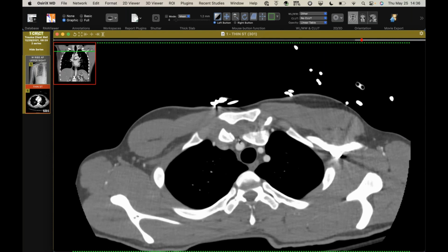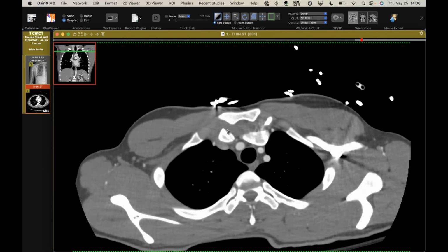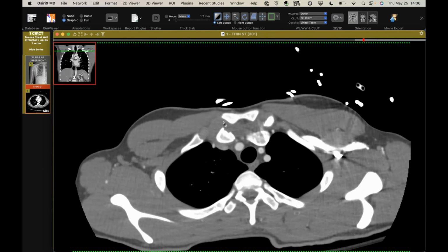This is not that common of an injury, and it's usually associated with high energy trauma because it requires a direct blow that disrupts this capsule. Sometimes you'll see it with a distraction injury, but it's usually associated with severe injury to the arteries, the vasculature, and the brachial plexus. There's often a lot of fractures here too, the thoracoscapular dissociation. But in this case, it was a direct blow, and because he's young, his bones are pretty tough. Probably the capsule gave rather than the bones.